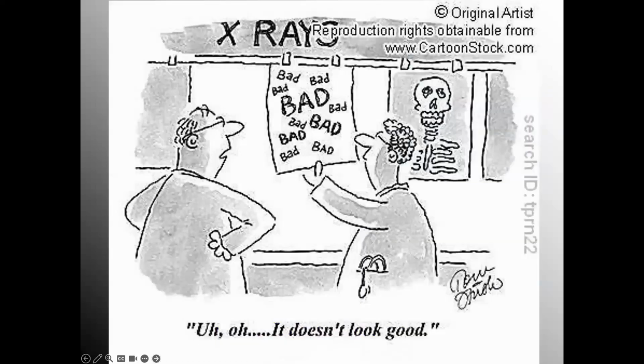Now look, I'll give you a little insight, especially those of you who want to delve a little deeper into x-ray and are afraid you're going to say something in front of the radiologist or the pulmonologist that doesn't sound just right. It's never wrong to do a courtesy pause and to say, interesting. Because if you expected something to be there that wasn't, it's interesting. And if you find that something you thought was there is not, isn't that interesting? So a courtesy pause with a little "that's interesting" will always get you in good graces most of the time.